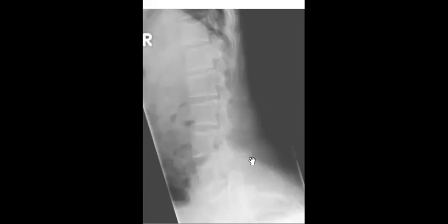Then your question will be, what is the differential diagnosis? So they like to mention Salomon. S for spinal cord tumor. This is maybe a more localized form of scalloping, especially in the interpedicular region. Yes. And A, what it will be referring to is achondroplasia. Perfect, achondroplasia.